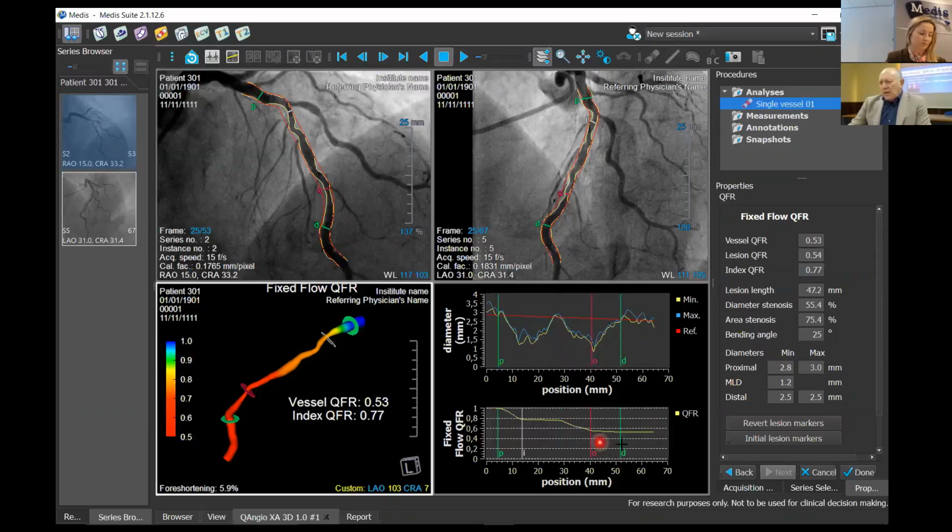For example, you can use the pressure curve to establish how long the stenting should be. If you look here, you must keep the boundaries, the edges of the stent, of the coverage of the artery, from the point in which the pressure stabilizes, like here, for example, the distal part, and here where the problem begins.